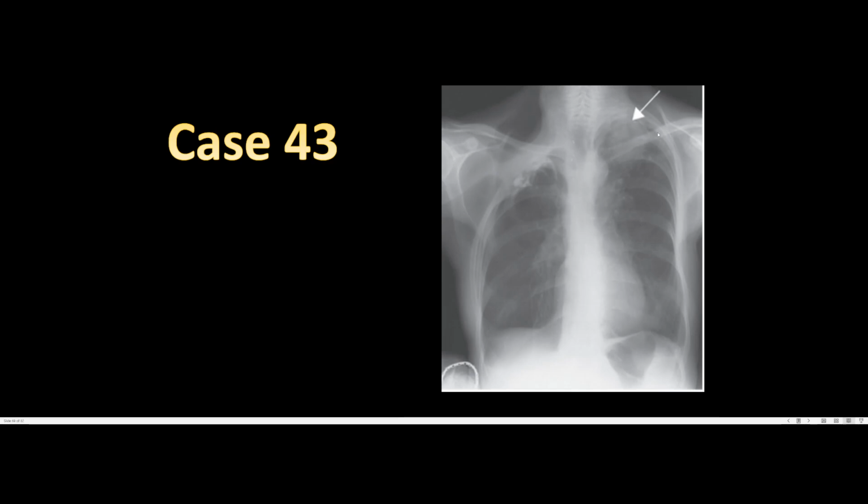Everything looks normal, but you can see there's a soft tissue density mass within the apex of the left lung, and it looks to be compressing this portion of the lung near the cervical vertebrae. Again, you take a biopsy or you do a chest CT and you go from there. But we will assume from the patient's history that the differential diagnosis is Pancoast tumor.